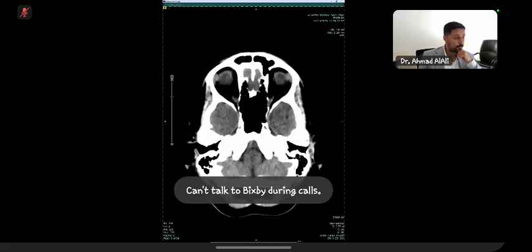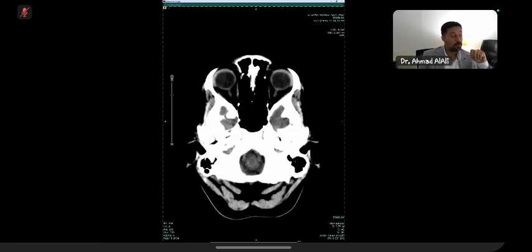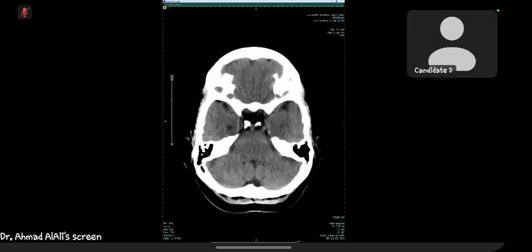Anything else? Let me help you out with targeted questions. Can you see anything in the sulci or ventricles?